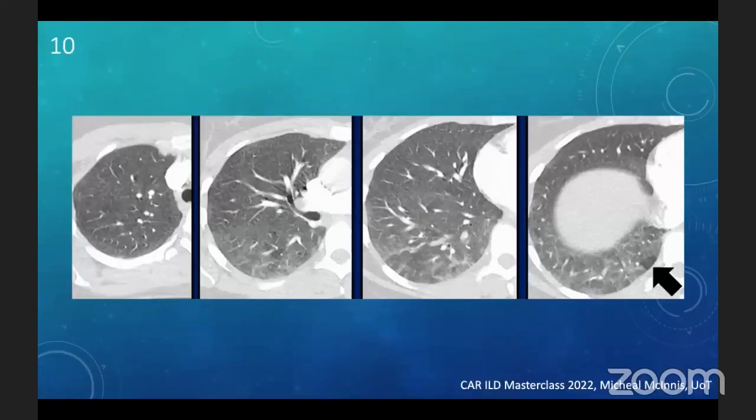So your ER physician calls you on your on-call and tells you he wants to rule out acute pulmonary embolism. You do a PE study, and then after doing the PE study, you figure out that this patient has ILD. What to do now? Look at this. There is a carpet of very faint ground glass opacities in the lung, actually, right? But you wouldn't really be sure, because is that a true parenchymal opacification or true ground glass opacities?